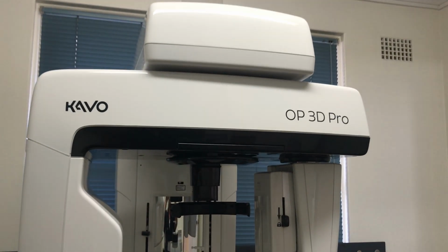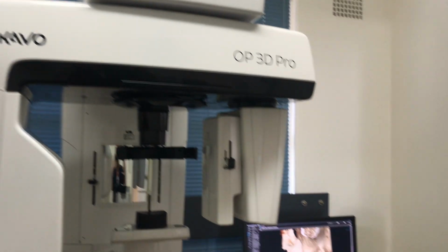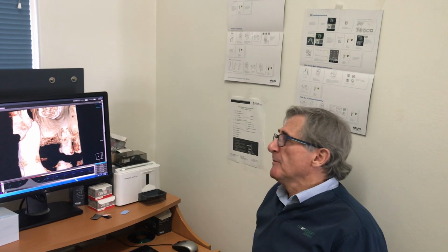Terrific, Sean. Good afternoon. About the KaVo OP3D Pro, and we'll look at the case of the week. What have we got today, Steve? The case of the week this week is a gentleman that presented with a pain on his upper right 6, on tooth 1-6, and the OPG showed some bony change within the roots. It's an old root treated tooth from way back somewhere else, and once I did the 3D imaging on the KaVo OP3D Pro, the true diagnosis of what's going on here was easily seen.